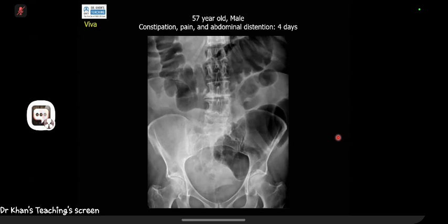This is, yes, small bowel, large bowel. What is this? Large bowel. Complete or what? On radiological criteria. And why do you say complete? Perfect. So, madam, radiology. Yeah. So this is my second favorite topic, convert people to radiology. And I've been able to do quite a few over the years. So I'll be available in the break.